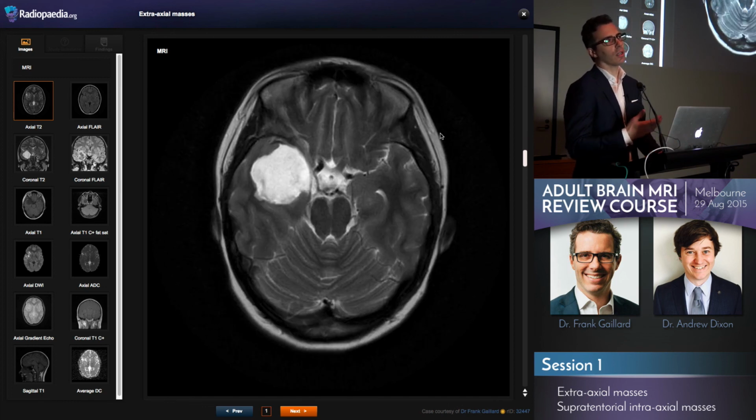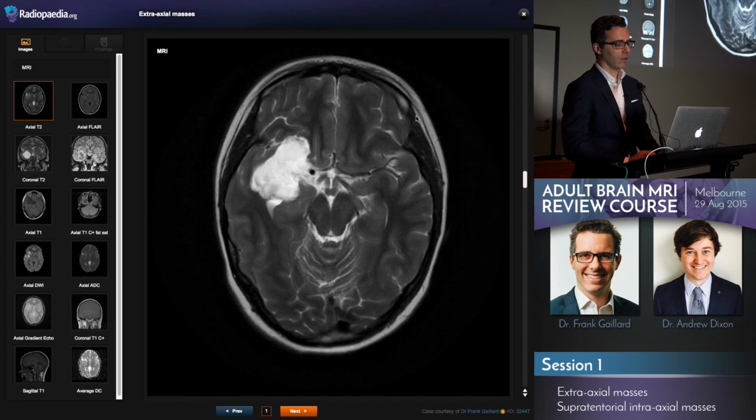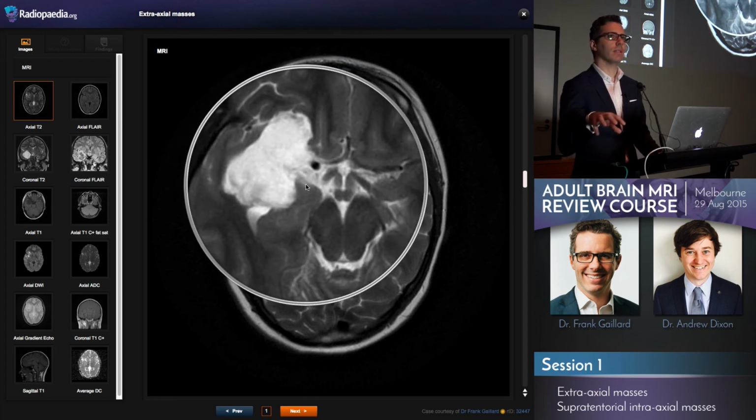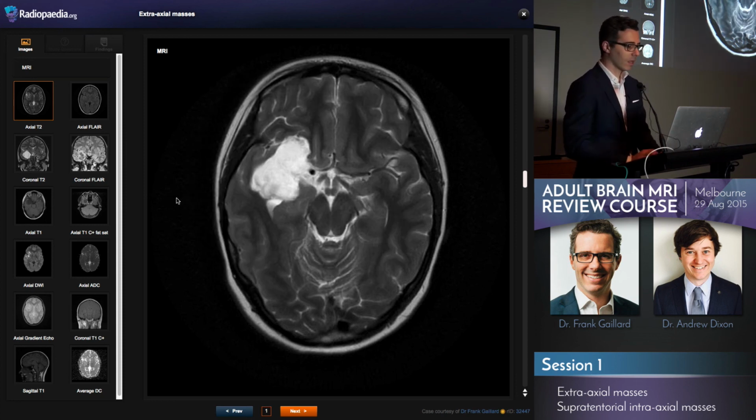I think the literature talks about this as if it's a bigger diagnostic dilemma than it actually is, because modern imaging can tell them apart fairly easily. They can look very similar to CSF on CT, but on modern CT, where you don't have as much streak artifact, usually you can see some heterogeneity to the signal, which doesn't quite follow CSF. On T2, again, it's not quite as clean as you'd expect. The other feature is that it has a scalloped border. It tends to insinuate into compartments and wrap around vascular and neural structures, making them very hard to fully resect.